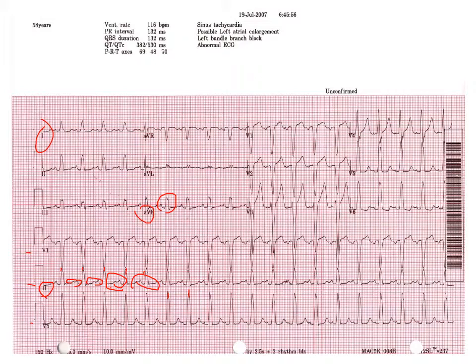All right. What about your precordial leads? V1, 2, 3, 4, 5, and 6. Do you have ST elevation? Maybe. Here's where it gets tricky. Why do these waves all look kind of odd? Really big QRS complexes, kind of wide, and kind of uniform between V1, V2, V3.